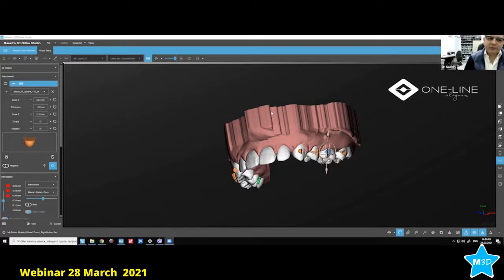But we have also been doing negative attachments on premolars now to get better retention and to get more push on the anterior teeth. This is a new thing which we are working with our team: when we want to make torque, we need to have a spring movement. To get the spring movement, we do negative attachments on premolars, where the sheet will press on the premolars, and there is a power ridge on the anterior side.